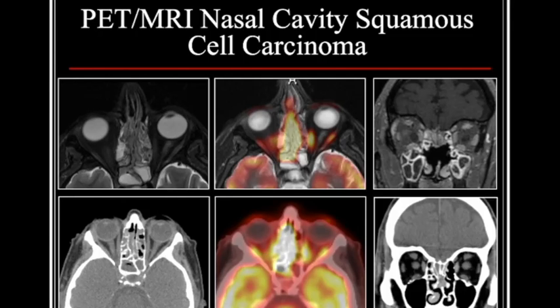Contrast can also help in distinguishing tumor from adjacent secretions. So here's a case study just showing all the various contrasts of typical sinonasal tumors. So here we have T2 hyperintense secretions trapped within the ethmoid air cells and the sphenoid.